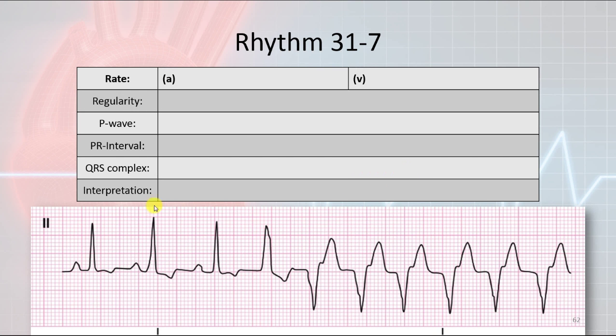I really like this 12 lead right here, or this rhythm right here. This is the last one, and then we'll move on. What is my atrial rate? This is pretty cool because we do have an atrial rate over here. Now our atrial rate up to this point is different than what we would calculate for the whole strip. If you calculate the atrial rate up to this point, you could say it's 300, 150, 100, maybe about 90.